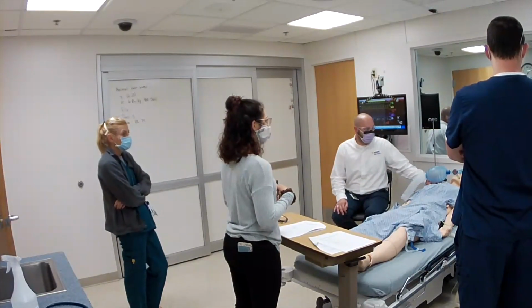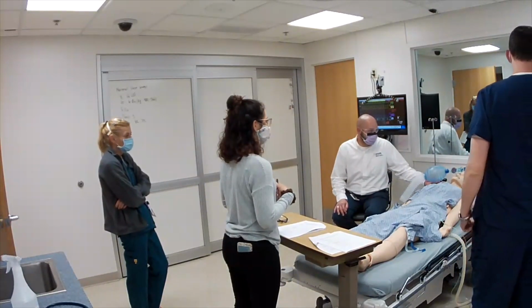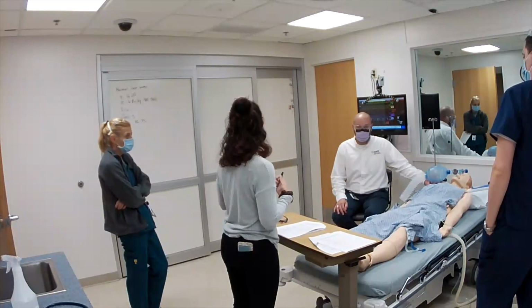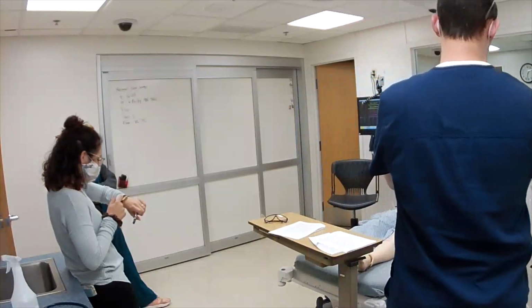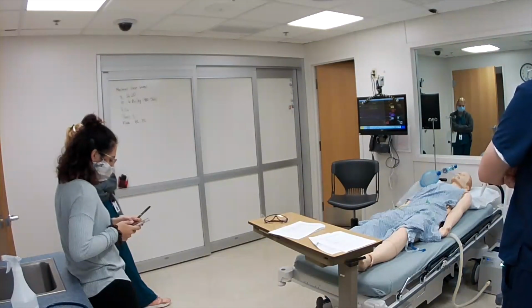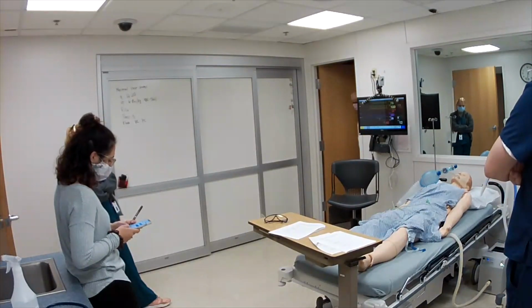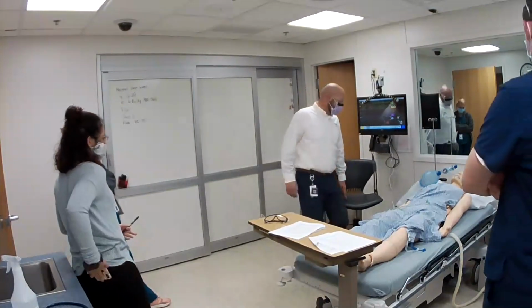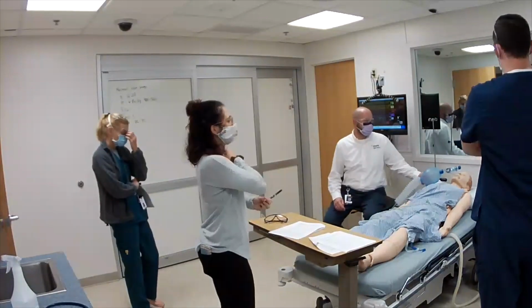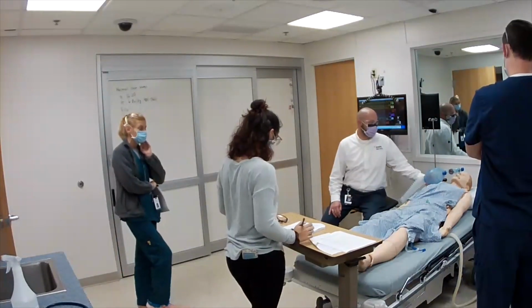So 480 to 560. We're on 560 there. I'd probably do like 520, 510, something like that. I just put in 510. Anything scientific you did to come up with that, or just a range? Yeah, just pick something in the middle. Yep, I agree. What about your rate? Like you said, anywhere from 12 to 20. So 14, 16 is usually what I'd start at. Okay, sounds good. What's next?